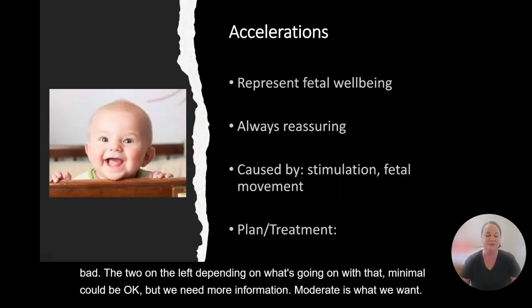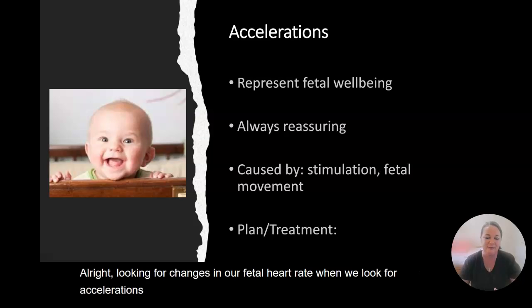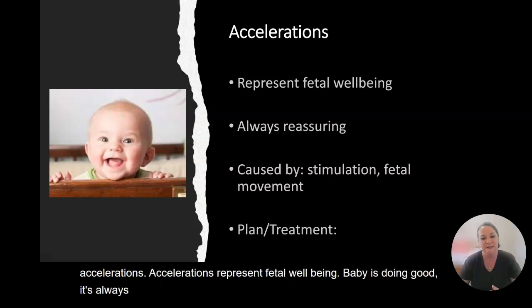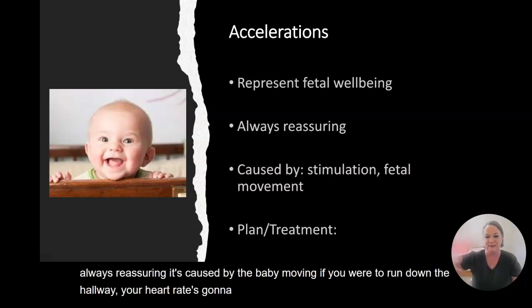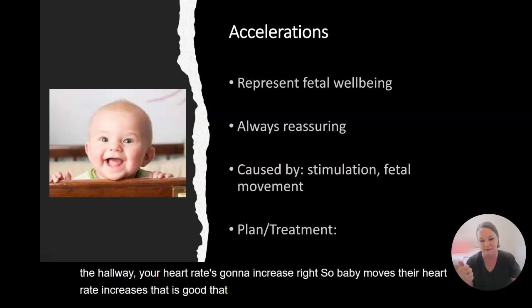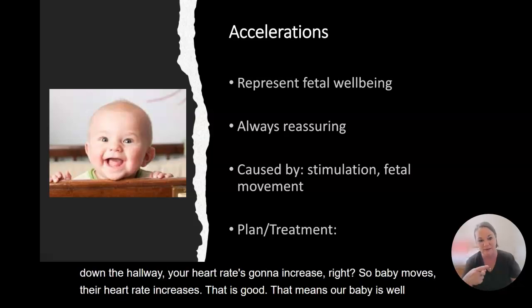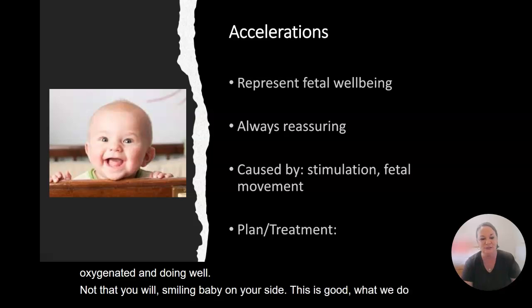All right, so looking for changes in our fetal heart rate. When we look for accelerations, they represent fetal well-being. Baby is doing good. It's always reassuring. It's caused by the baby moving. If you were to run down the hallway, your heart rate's going to increase, right? So if baby moves, their heart rate increases. That is good. That means our baby is well oxygenated and doing well. And that's why I put that cute little smiling baby on your slide. This is good. What we do with this is we just continue to monitor.